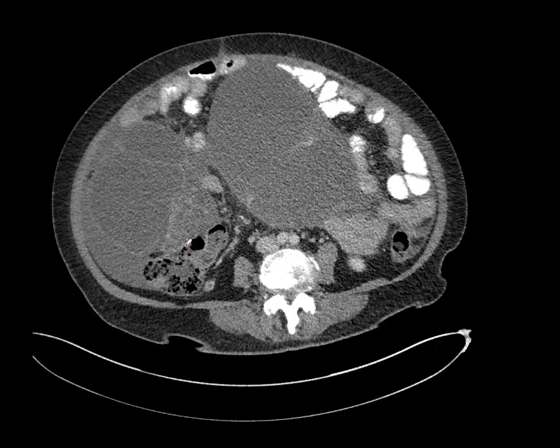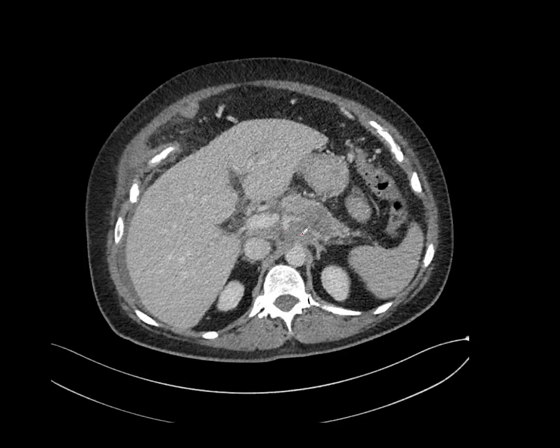Here's another lady who presented with large bilateral ovarian masses. These were assumed to be primary ovarian malignancy. The patient showed up at the gynaecological multidisciplinary meeting. But of course, there was a primary pancreatic carcinoma here, which hadn't been appreciated on the imaging. And there is a peritoneal tumour deposit which is suitable for biopsy.